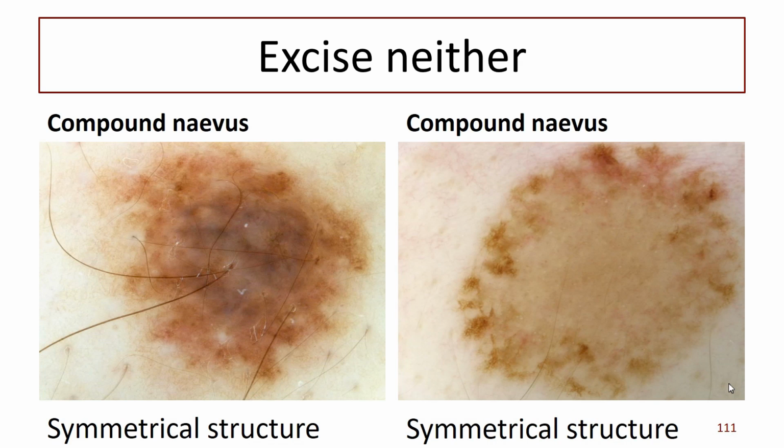The thick lines don't tell us whether it's benign or malignant. They tell us that there's hairs in it. And thick terminal hairs within a lesion tell you that it was present before the age of 10 years. Because they're not really melanocytic nevi at all, they're organoid nevi. That's to say you've got growth not just of melanocytes but also of other components of the skin. So sometimes they're very warty, sometimes they're very hairy, but they often have a few thick terminal hairs. And this lesion was funny and stable forever.